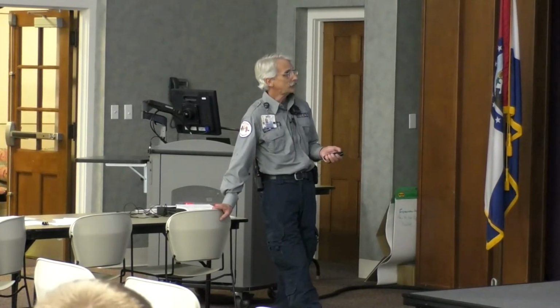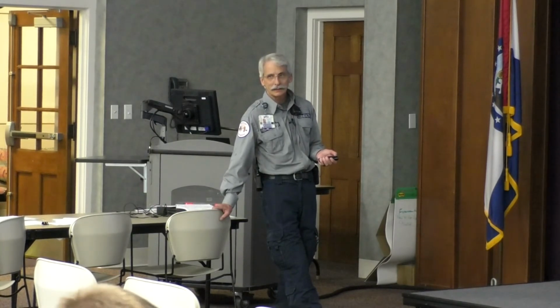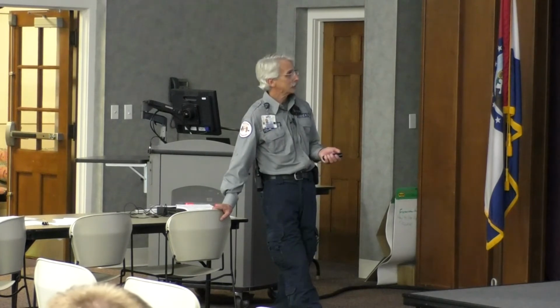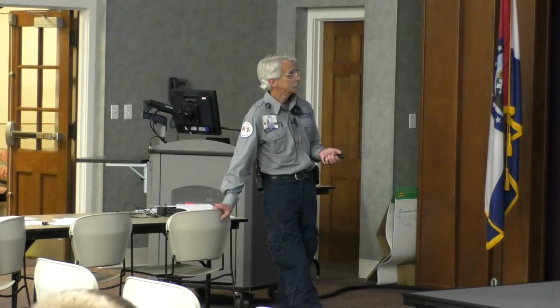Okay? Do we see any reciprocal changes? Not really, do we? So does that rule out an MI? It does not. Thank you. It does not rule out the MI.